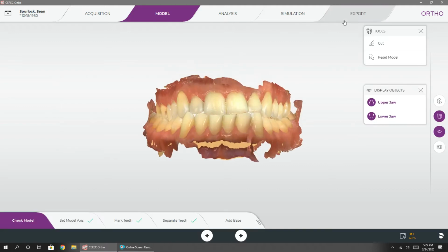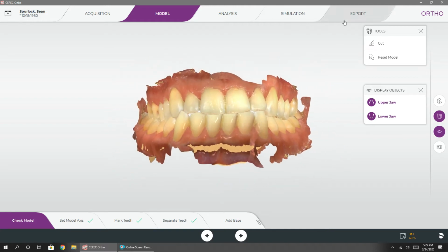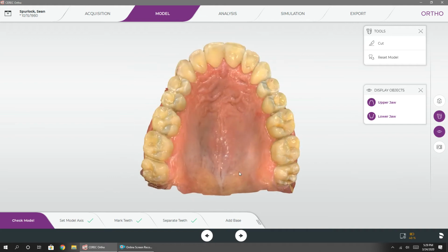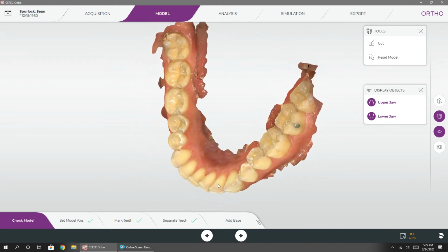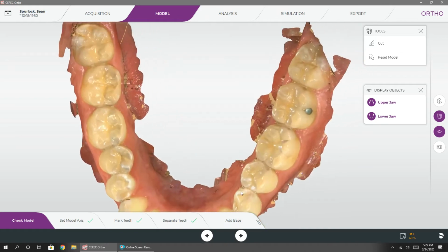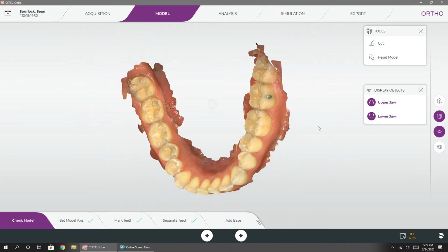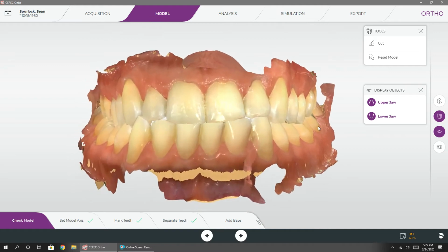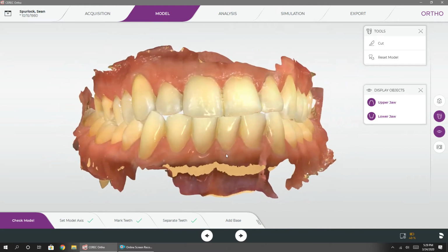But I think this new software, here's the final scan, digital upper and lower of my jaw. So you can see just the quality and the detail of this image. The Primescan's 19 microns of accuracy. Which is, it obviously shows up. I could use a little bleaching, I can see, but don't have many restorations, but you can see how it does as far as picking up on metallic restorations. It's going to give not only the general dentist, but the specialist orthodontist some amazing tools for education analysis, as well as treatment options for their patients.